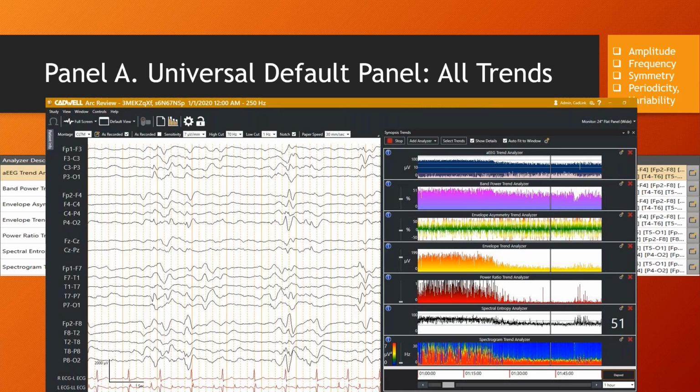an assessment. And remember, when we talked about the amplitude integrated EEG, and we talked about how we identified burst suppression by the flattening of the record. So how the base of the trend is down at the zero baseline. So this tells us it's a pretty flat record. Early in the record, our cursor is actually placed out there later in the record. So the EEG that you see to the left has less flattening than what we saw earlier in the record. It also has lower amplitude bursts.